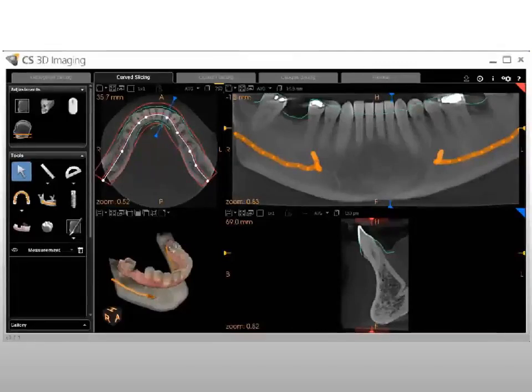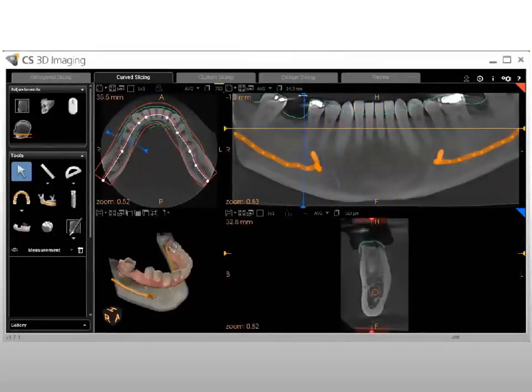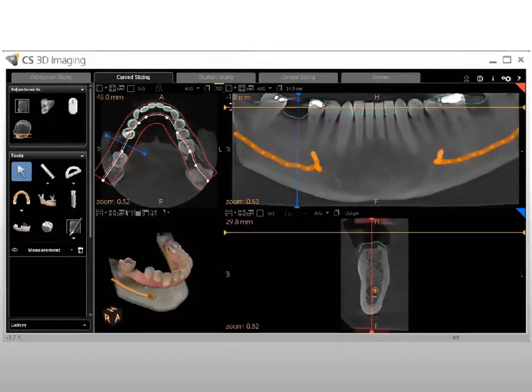To select the initial crown position, use the yellow and blue grab handles to adjust the position of the axial slice plane in the panoramic and oblique coronal view screens. To optimize crown placement, set the blue vertical grab handle of the axial plane at a right angle in the reconstructed panoramic view screen, and set the yellow horizontal grab handle with reference to the occlusal plane and the position of the adjacent teeth.